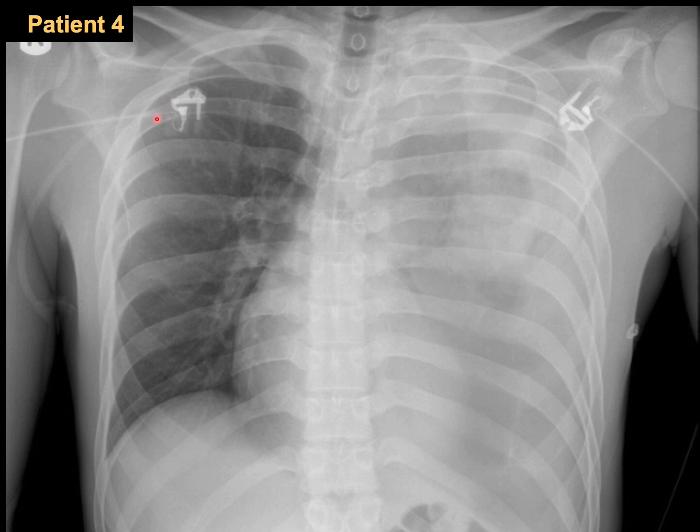Let's start with the normal, or the one he is not complaining of. I think you have all appreciated that it's okay here. But when you look here, well, it's whitish. Okay, whitish in the setting of trauma could be collapse or massive hemothorax. So it's whitish, and this patient is having a left side massive hemothorax. It's very clear here, and the diaphragm is very pushed downwards, and this patient most probably is going to be shocked or hemodynamically unstable.